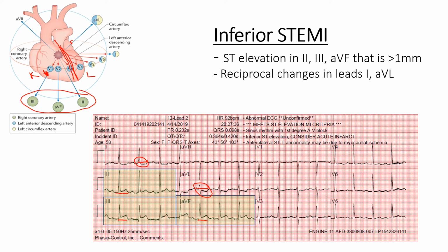And then you can still look at the rest of your vascular territories as well. So all of these are your anterior leads. Some of these are higher lateral. I don't really see if it's a big infarct. You may see this extend all the way. If 1 and AVL are seeing reciprocal changes, sometimes you can also see reciprocal changes with an inferior STEMI in V5 and V6. We don't see that here, but that's another place to look.